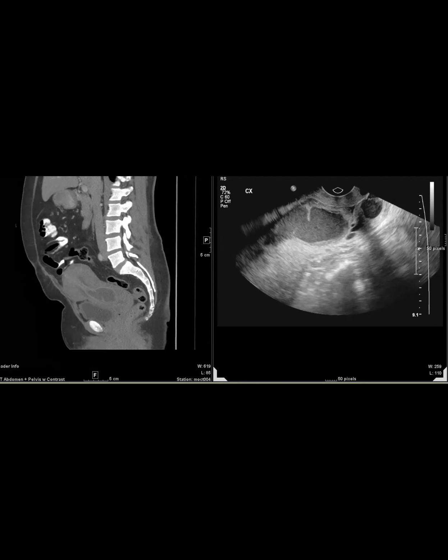Victoria, in retrospect, with that ultrasound, are the low level echoes almost mimicking an endometrioma? I think so. I think that's like a chronic, you know how they get these in adenomyosis, they get these chronic hemorrhagic foci from dilated subendometrial glands. I think that's what we're looking at here, just kind of like a blown out subendometrial gland.